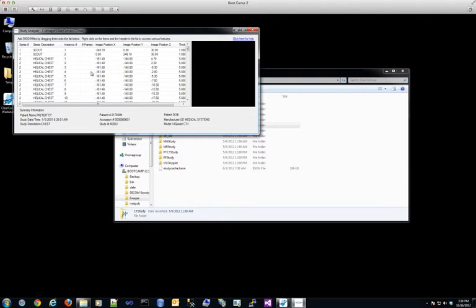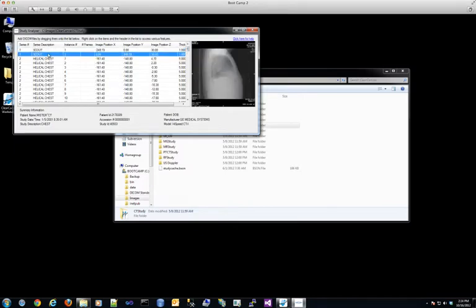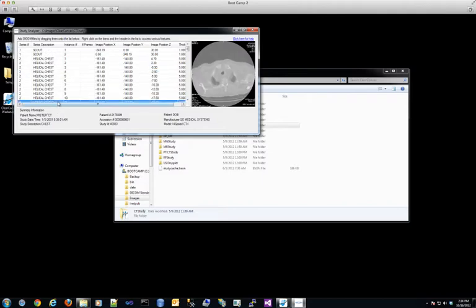In this area of the screen, you'll see a grid control showing the common attributes. And you can do a couple of things here. One is you can select an image by left-clicking, or select a file, and it will actually load the image and display it over here. So you can get a quick review of what's on the file system from an imaging point of view.